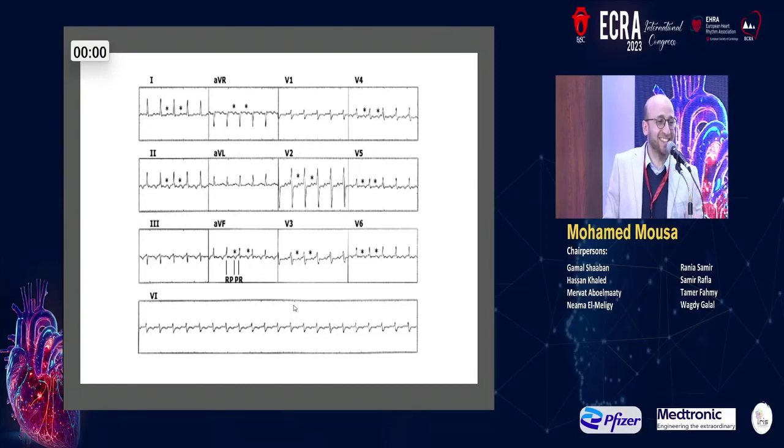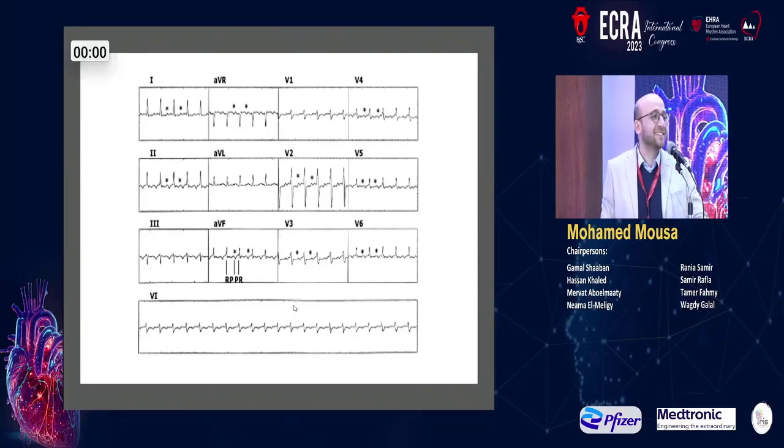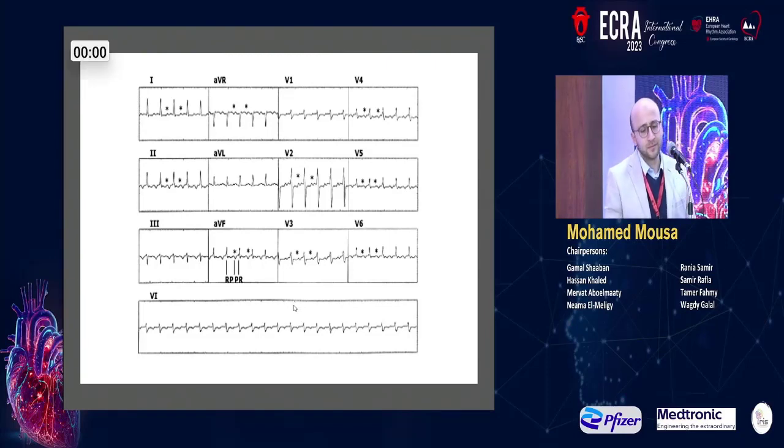It's complicated. I think if I see this, I will not say this is atypical. I will say I don't know. I have to do some maneuvers. But if you look at lead 2, there seem to be some variabilities in the RR interval, and the P to P interval is getting shorter before the R to R interval. So I think I have to measure, because this could be a flutter in a 65-year-old.